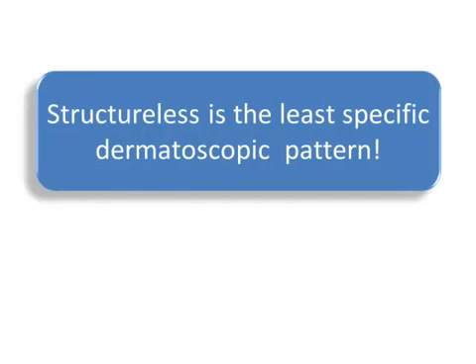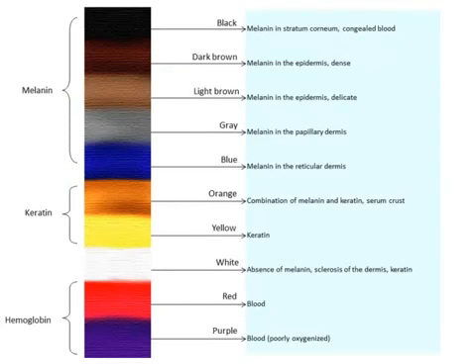As a general rule, in comparison to other patterns, structureless is the least specific dermatoscopic pattern. We have no structure, and we cannot use structure to make differential diagnosis. So we are left with color, correct? We have to use color to make meaningful differential diagnosis.